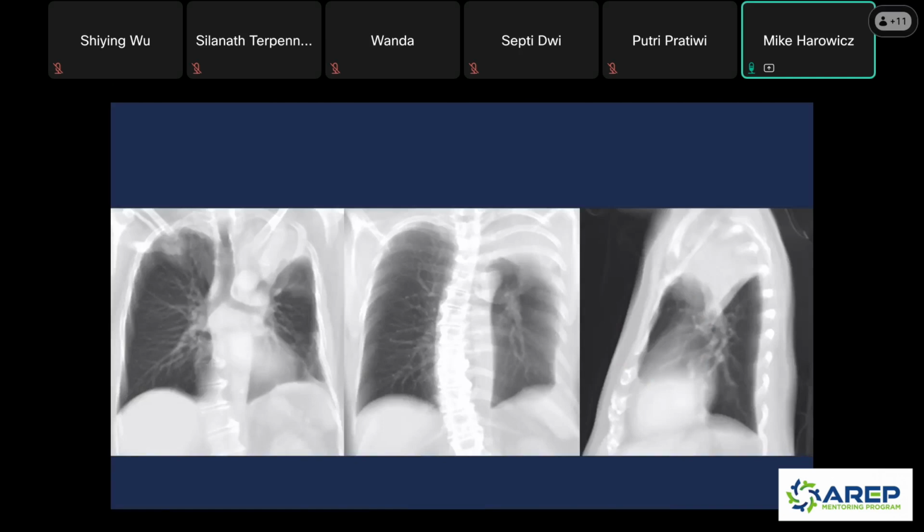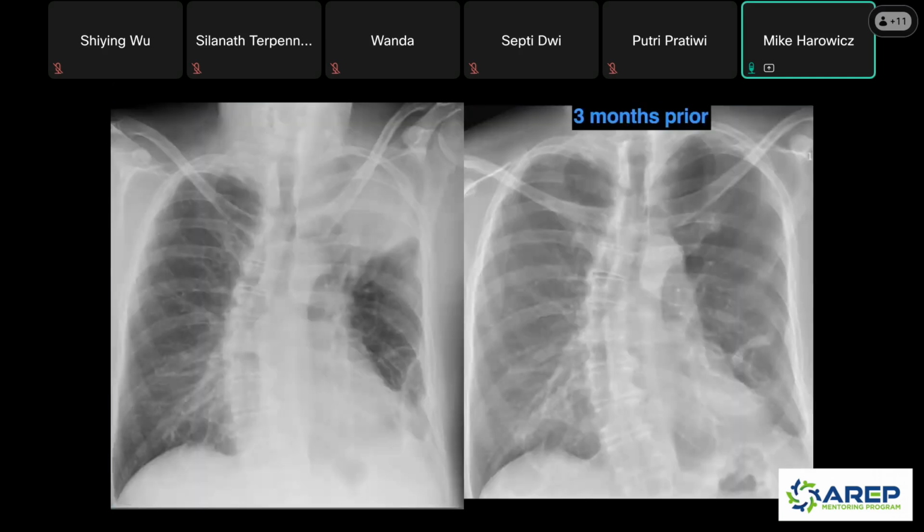But when you get more posterior, right, your left lower lobe actually goes pretty high. The superior segment is pretty high in your chest, and that area is going to stay aerated, right? It's actually going to get pulled up a little bit because of the volume loss of your left upper lobe going down. So when you put all these things together, right, the tricky thing about a chest x-ray, it's all these layers just summated into one image. This is what you get. And this is actually what we call the Luftsichel sign. And it's a good look for left upper lobe collapse, right?